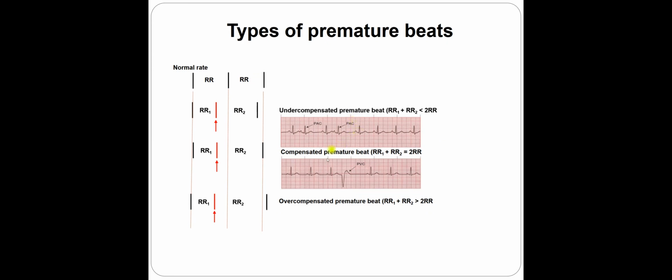If you do have a ventricular premature beat, we are going to talk about what the ventricular premature beat is, as the complex is different. This is not the same as before, it's wider and the T is inverted. So it means that it should be compensated.